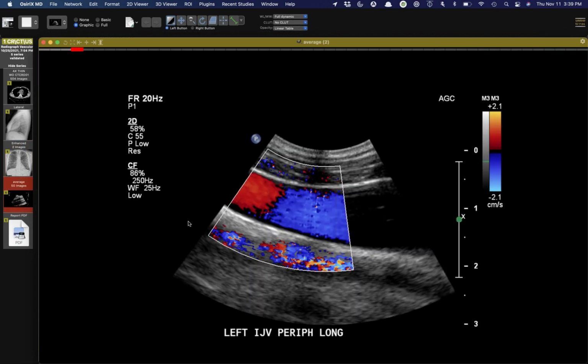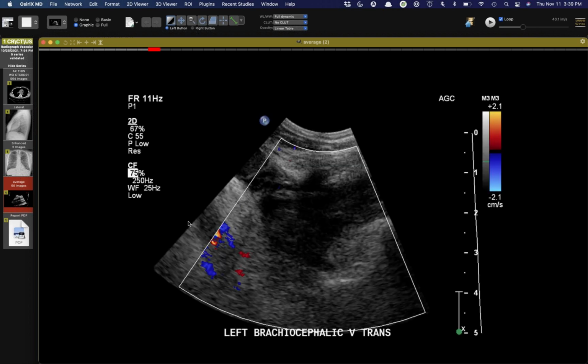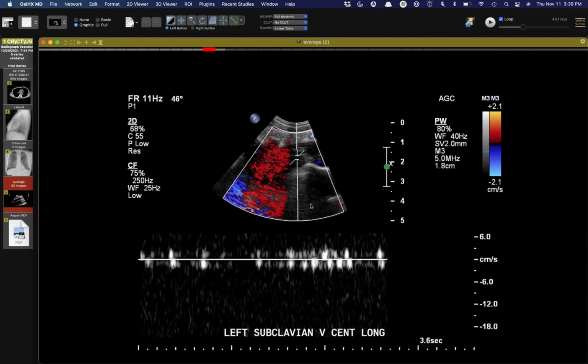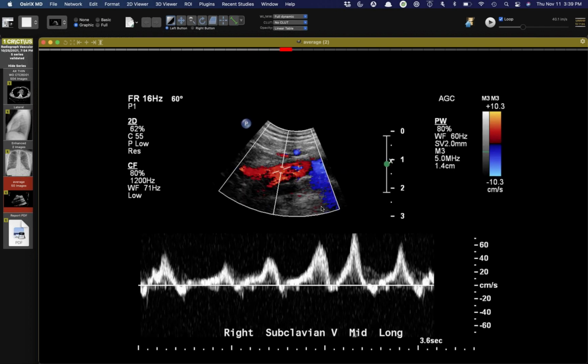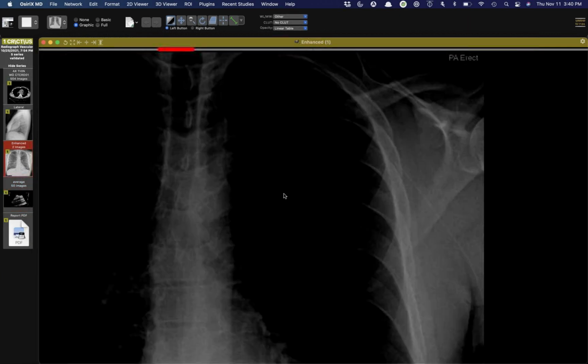They subsequently did an ultrasound here, and I had key images, but I guess they're gone, but I can quickly go through it. You can see there's the catheter, and there's a little bit of increased echogenicity surrounding it. There's very little flow surrounding it. Then there is a compression image, and you can see that with compression of the axillary and subclavian vein, there was no compression of it. So thrombophlebitis surrounding a PICC, diagnosed on the chest radiograph.